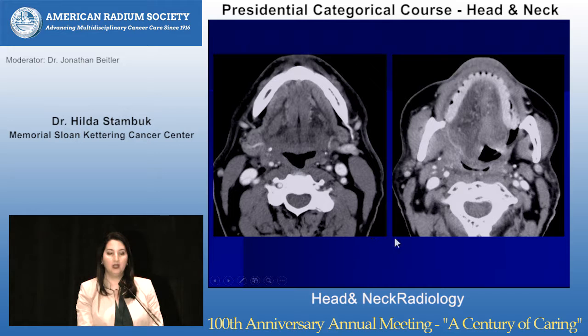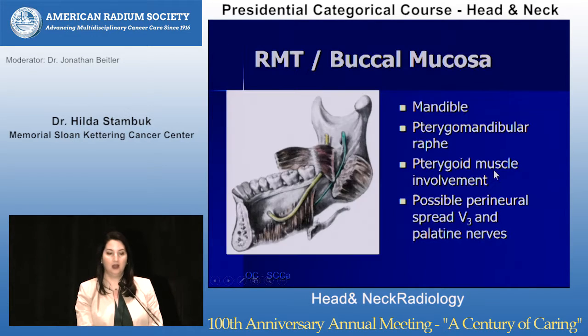I'm not going to show you all the images, but I want to show you another trip up that I see a lot. So this is right hemitongue atrophy. You can see it's fatty. The tongue, the base of tongue particularly, is flopping back into the lumen of the oropharynx. And people commonly call this a tumor. This is cranial nerve 12 was affected by this tumor next to the hyoglossus muscle, and this is your hemitongue atrophy. Don't confuse that with tumor.